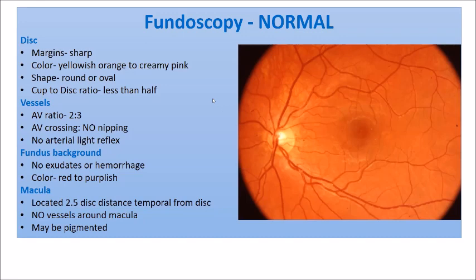Which side does the optic disc lie on and which side is the macula? This is the superior temporal artery, and the inferior temporal, in between them the macula, with less vascularity around it. The macula is for direct, central vision. This is the optic nerve head, and we perform fundoscopy obliquely from the temporal side. So this is a challenge for Faryal: try to identify left or right later.